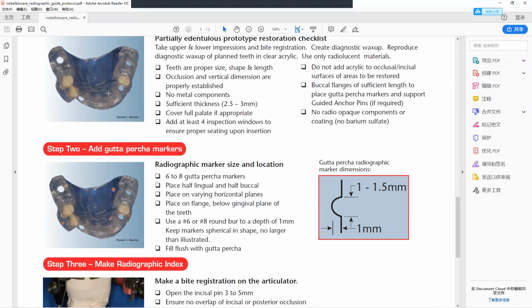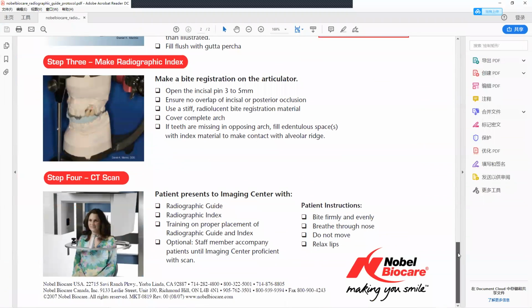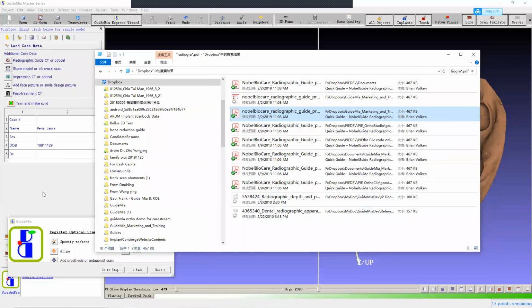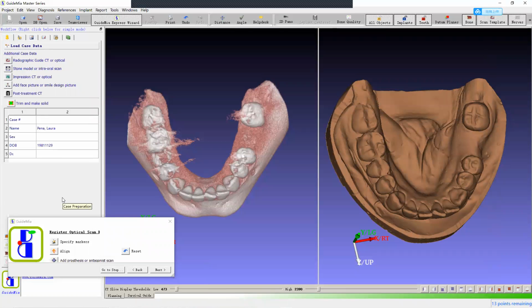I understand that, we do this already. But in the situation I'm telling you, the patient has every tooth, from 3 to 14, and all of them have restorations. There's a crown on each. So at surgery time, you need to do immediate extraction and then placement, right? Correct. I'll get to that with this case.